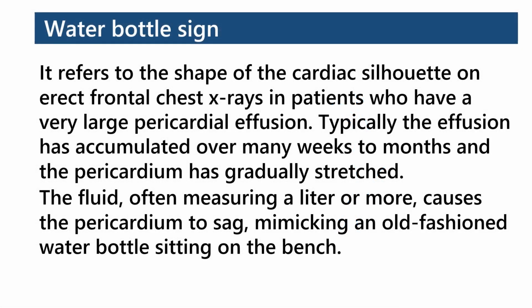The water bottle configuration refers to the shape of the cardiac silhouette on erect frontal chest X-rays in patients who have a very large pericardial effusion. Typically, the effusion has accumulated over many weeks to months, and the pericardium has gradually stretched. The fluid, often measuring a liter or more, causes the pericardium to sag, mimicking an old-fashioned water bottle sitting on the bench.